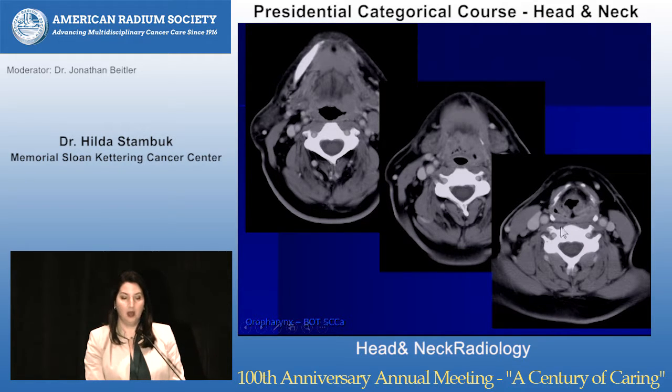Here we are in the larynx. This is a supraglottic larynx. You can see the AE folds. Here's the piriform sinus. Let's take that sharpened pencil lead, beautiful mucosal enhancement, nice and thin, making my way around, and wow, this is way too thick in the left piriform sinus. This is tumor extension into the left hypopharynx. You need to recognize it so the patient gets appropriate treatment.